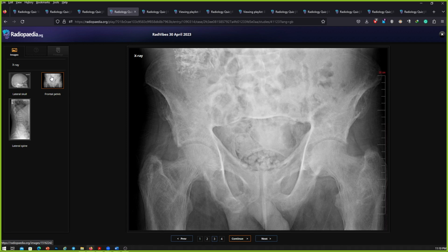This is the pelvis X-ray AP view of the same patient. Again, seeing the calcified pelvic mass within the right iliac region that could represent a calcified renal transplant. And there is asymmetrical sacroiliitis affecting the right sacroiliac joint. And there are multiple radiolucencies within the pelvic region. These could represent fecal material. However, they could represent urinary bladder stones.